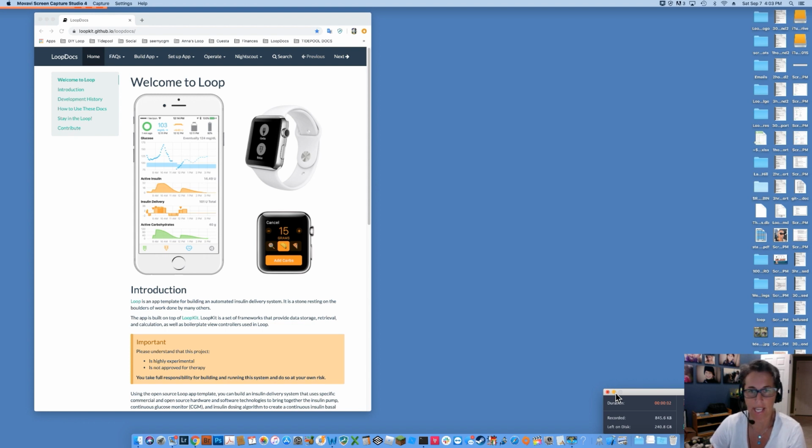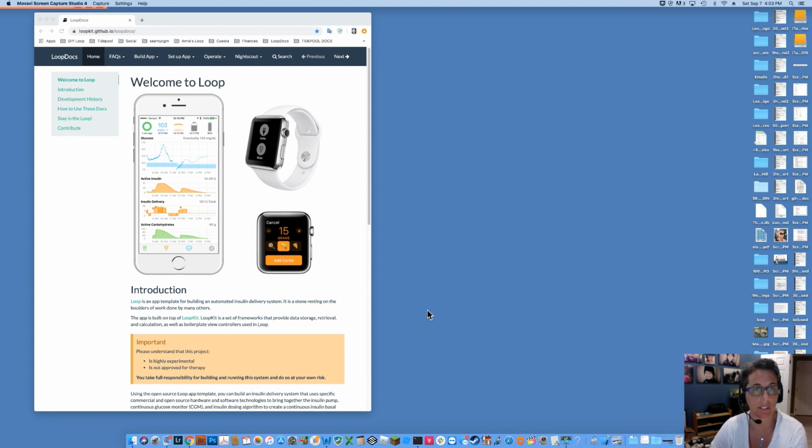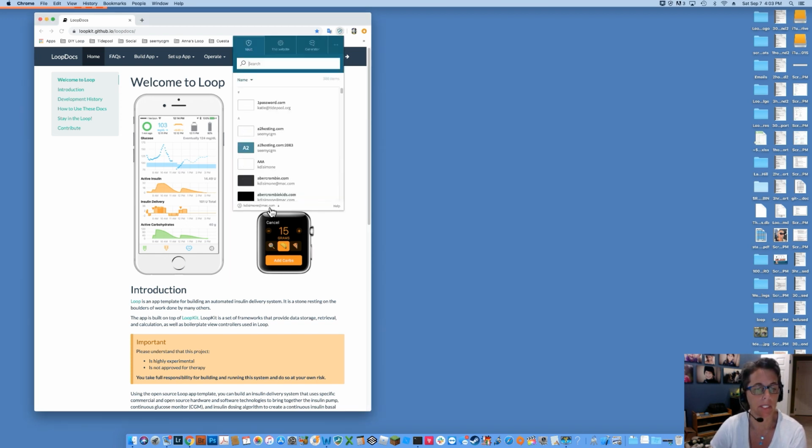Hi there, it's Katie, and today's video is going to be about creating your own Nightscout site. So we are going to go ahead and build a Nightscout site.